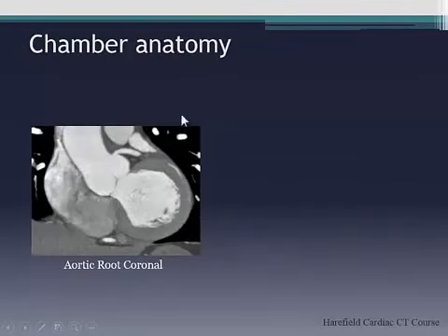Okay, so going back to the aorta. So if we look at the coronal view, start off, so when you're doing TAVI, for example, and you're doing measurements of the aortic valve, which I totally hate, but you always start on the coronal view. And the reason why is you can kind of see the insertion points quite nicely on the coronal view. And all you do is line up with the aortic valve insertion. So if you think about it, if you want to get the aortic valve on fast, you need to correct for the two planes of obliquity, okay, coronal and sagittal, to get an axial image, right? So you start off with the coronal image, you line up with the aortic insertion points or the hinge points, which you can see here and here.